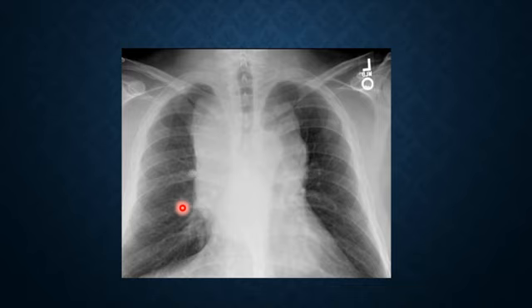Anyway, what about this one? The part above the clavicle, is it well defined or ill defined? Well defined, it's anterior. Above the clavicle here and there? This is not above, this is anterior. I think it is posterior because the lateral borders here are well defined. So it means this is surrounded by lung. Don't look at the apex of the mass. Look at the lateral parts of the mass.